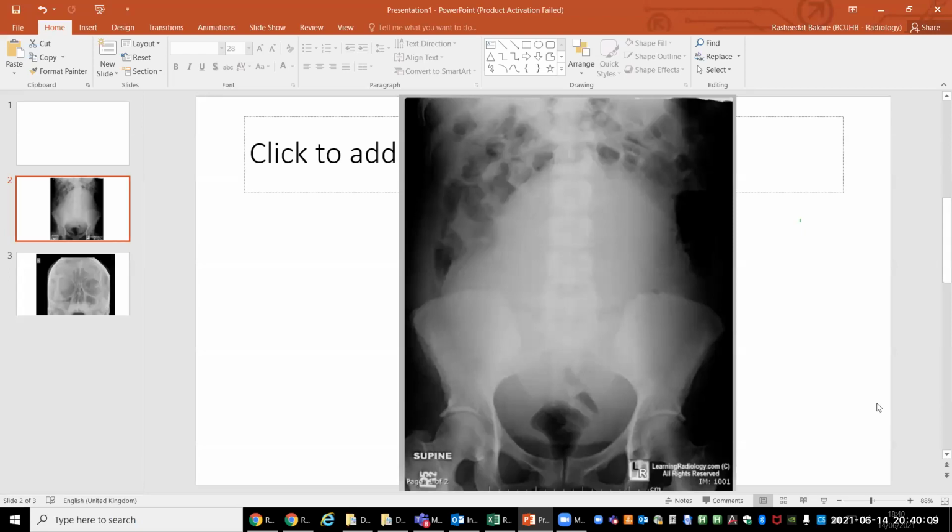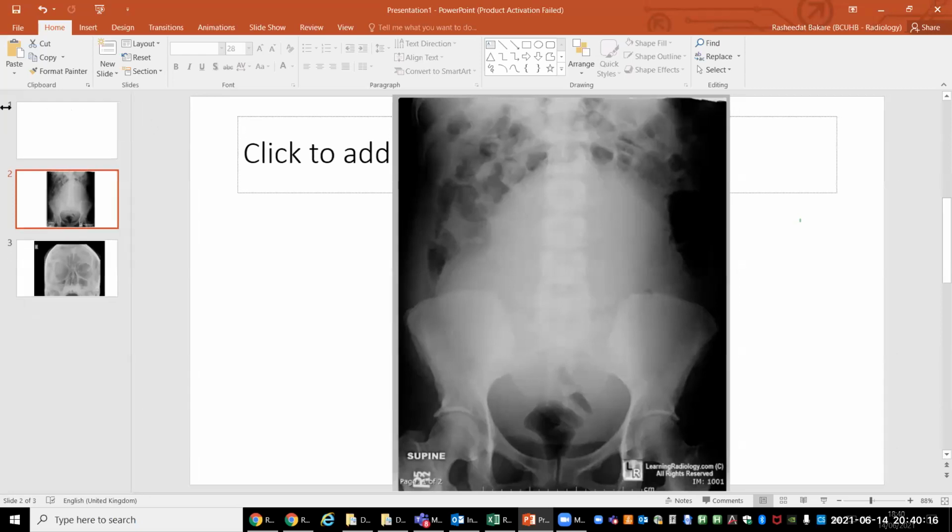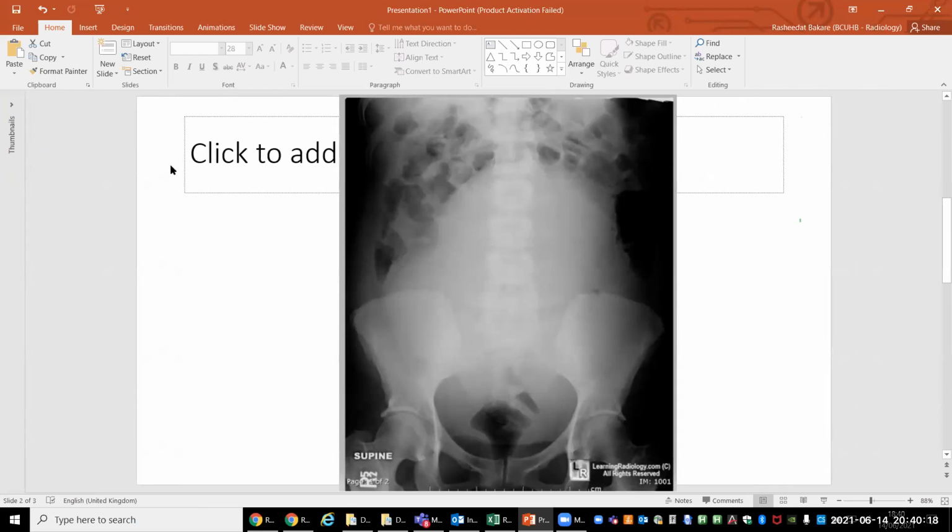I have been provided with the frontal abdominal X-ray of a skeletally mature patient, which demonstrates a large soft tissue density, which seems to be arising from the pelvis and going up towards the upper abdomen and displacing the bowel loops cranially and peripherally. I do not see any abnormal bowel dilatation. I can still see air in the rectum. Within the constraints of conventional X-ray, I do not see any free air.